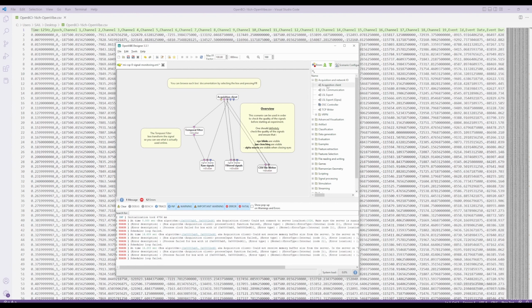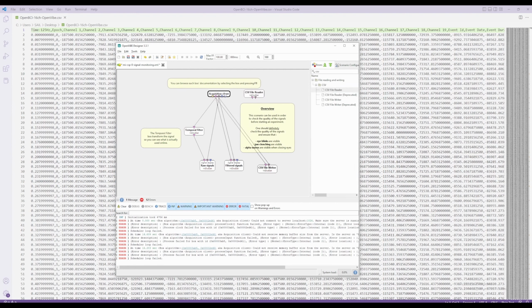So here, if I bring a CSV file reader box, let's just directly replace these. And the filter as well. All right, and can go ahead and disable this and this because we're not gonna rewrite it.